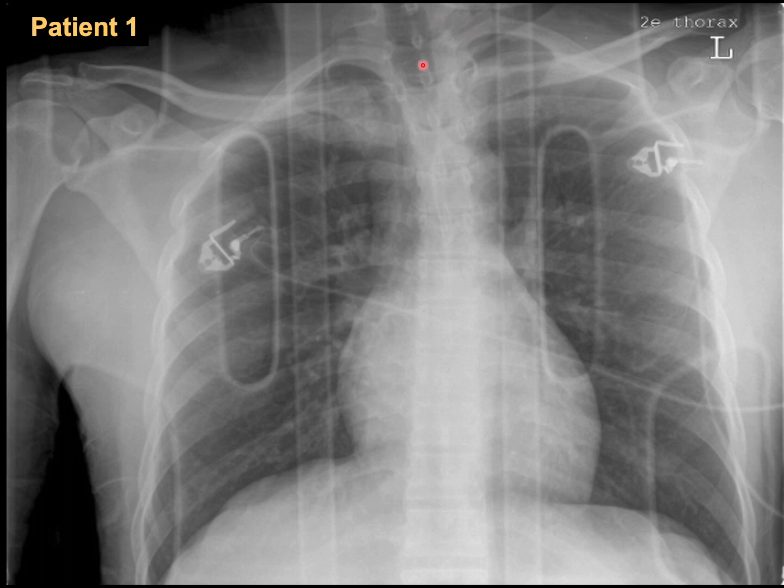Okay, so the airway, it's fine. Then the B for the lungs, breathing. I'm not very happy with this one because it's not sufficient. Then, okay, diaphragm, I can see, cannot see, this is a good thing. Then I can see here.